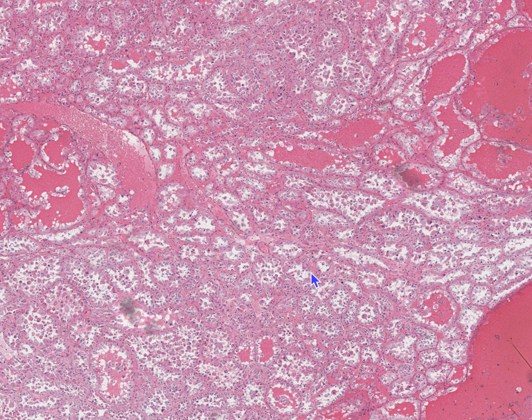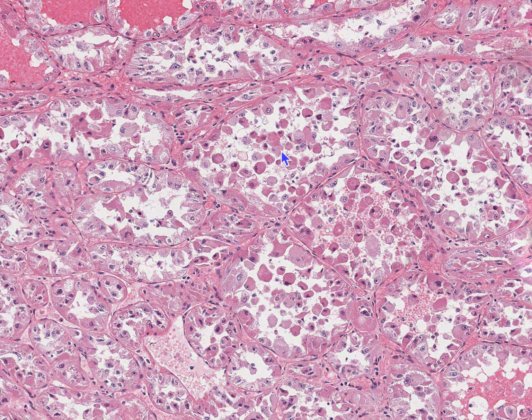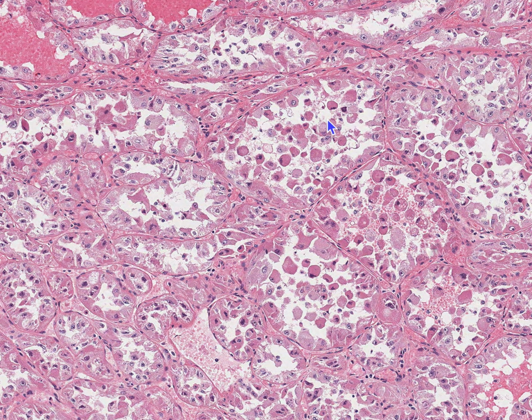And then if we look at these nests of cells, they remind you of alveoli, so the architecture is pseudo-alveolar. In the periphery, you have the cells that attach, and then you have these middle cells that detach and slough off. Personally, I like to think of it as reminding me of the solid pseudopapillary neoplasm of the pancreas, with that kind of sloughing. But cytologically, it looks much different.